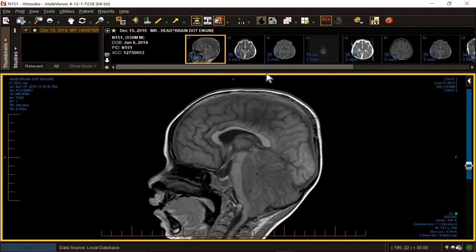And while you're looking, I'm sure you have observed a large mass in the posterior fossa. What makes posterior fossa masses so different is the tight space. So mass effect in the posterior fossa, whether you're dealing with primaries or metastases, is often more catastrophic and more dangerous than in the supratentorial space. We have a large lesion.